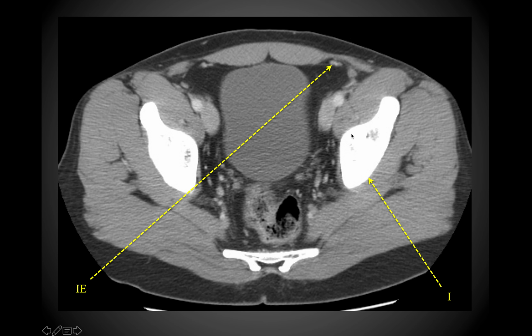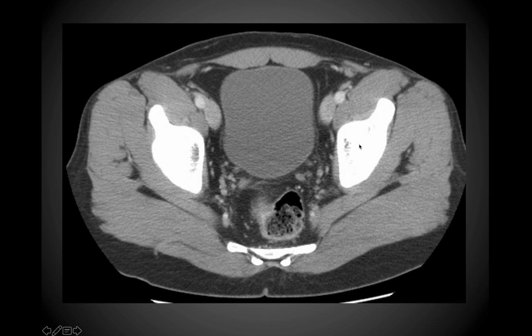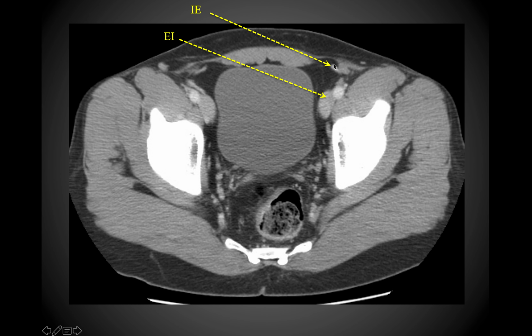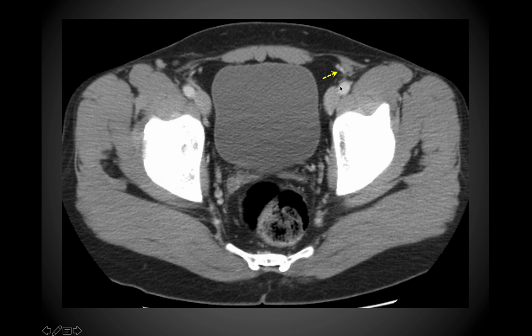And then we have the ilium right here with the iliopsoas muscle on its anteromedial surface. So as we continue going down, watch this area here. So again, we're going to start here. Keep an eye on the inferior epigastrics as we descend, and you're going to see them ultimately anastomose here with the external iliacs. So here you have that connection between the external iliacs and the inferior epigastric vessels where they're coming off.